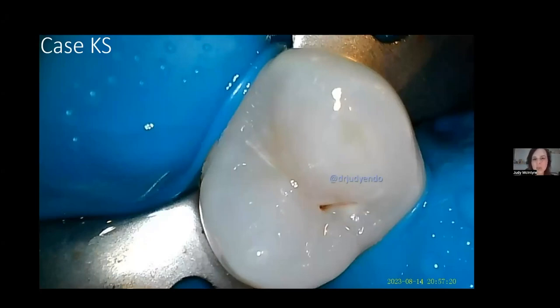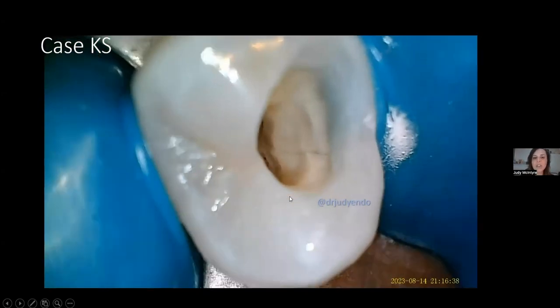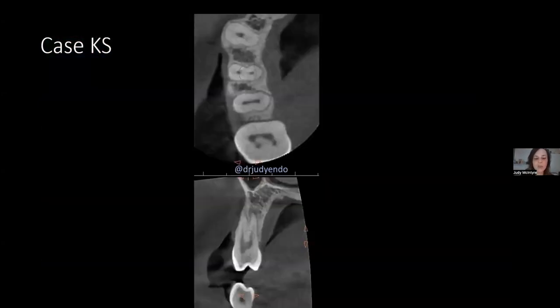Well, the test was necrotic. And even still, I've worked on hundreds of necrotic virgin teeth, but it still gets me because it's so mind-blowing that a virgin tooth can necrose, right? And every single time I have to enter virgin teeth, it freaks me out. So sure enough, you can see that there's a tiny, tiny, tiny craze line that extended into the pulp chamber. And this tooth was necrotic. 2 roots, 2 portals of exit.